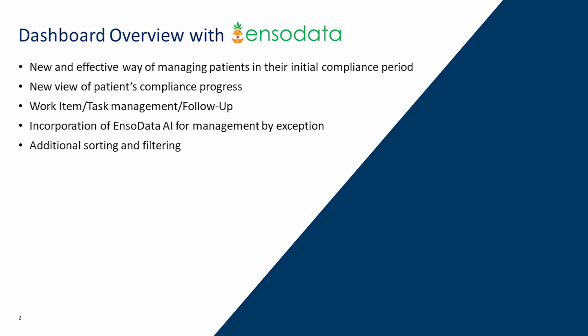This algorithm provides data on your patients in the dashboard to make managing your patients easier by providing you a way to manage by exception. The algorithm is built using 250 million nights of data from 147,000 different patients.